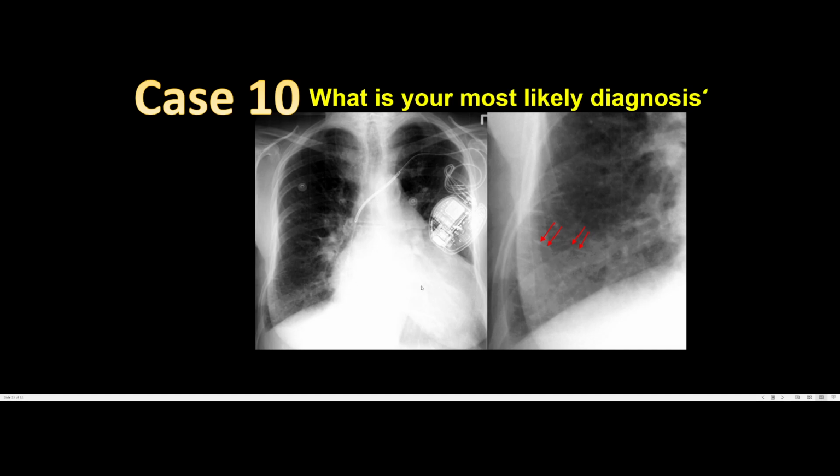The heart makes up more than half of the lung parenchyma. If we compare the horizontal diameter of the heart, you divide the horizontal diameter of the heart over the horizontal diameter of the lung. So if we were to measure it through cardiothoracic ratio, it'd be more than 50%. So there's a clear-cut case of cardiomegaly. You know what I mean?